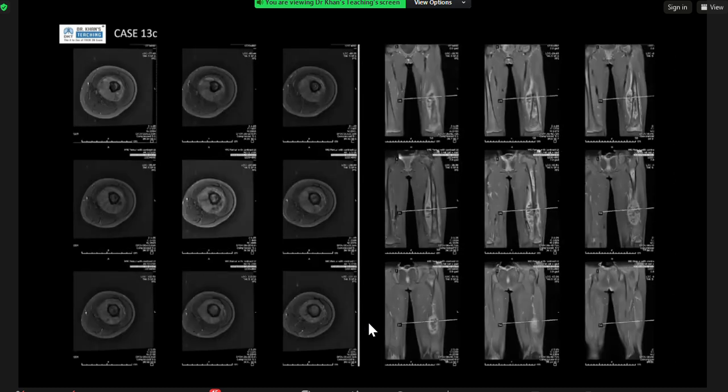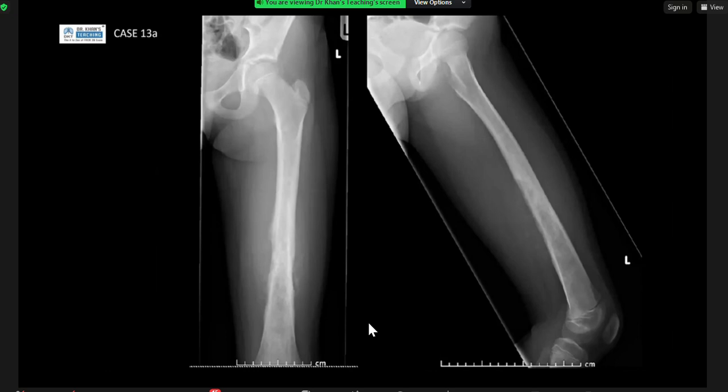Good. I'm just showing you some axial imaging, that extensive periosteal reaction, that extraosseous soft tissue, and you can see some post-contrast imaging there as well. So this is the most common malignant primary bone tumor in children, osteosarcoma. And then you have the less common subtypes, and we've mentioned one before, the telangiectatic, etc. These are aggressive metaphyseal and metadiaphyseal lesions. And you saw on the plain film, this is a really nice plain film showing that aggressive periosteal reaction, which you really nicely described. And particularly on the lateral, you can see distortion of those soft tissue planes and that chaotic appearance of the bone.